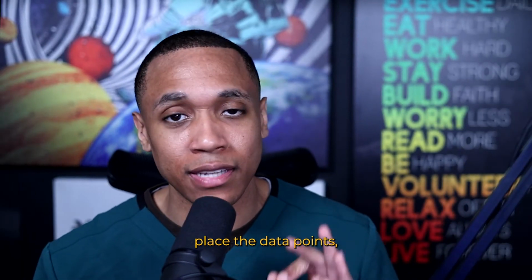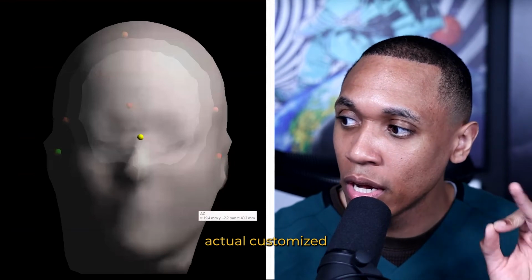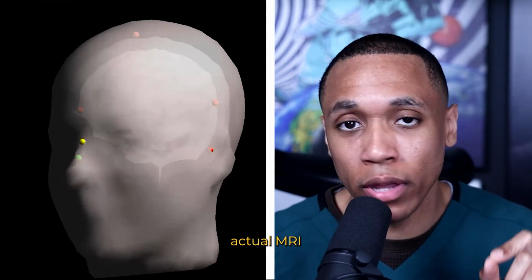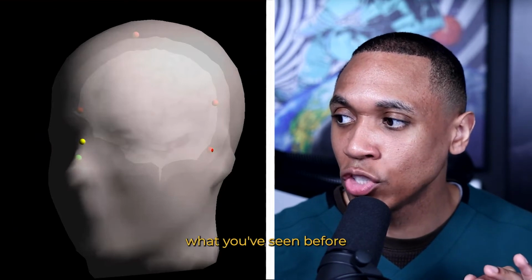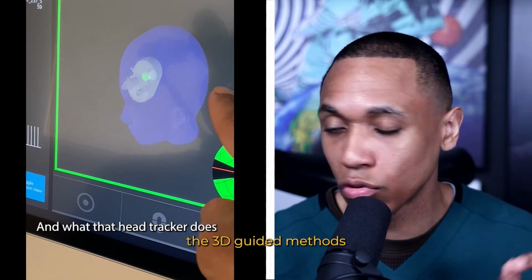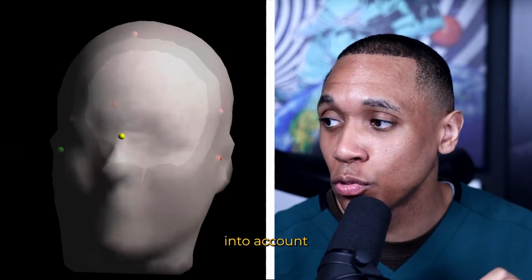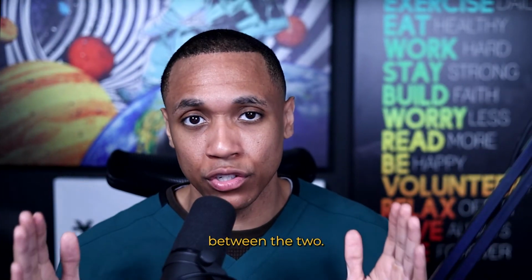And once I actually place the data points, I create a head model, and this is what it looks like. This is an actual customized head model based on this person's actual skull, based on this person's actual MRI of their brain. Now, if you look, this looks somewhat similar to what you've seen before with 3D guided methods of administering TMS. But now you can actually see inside of the skull, and we're taking into account the brain, the different size, the different shape, and the separation between the two.